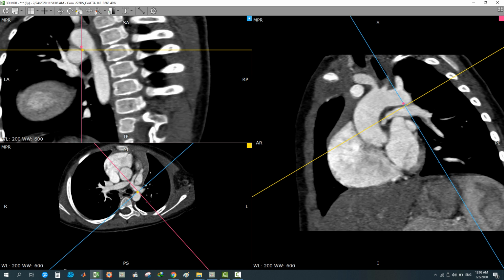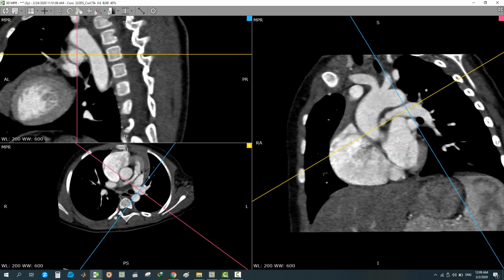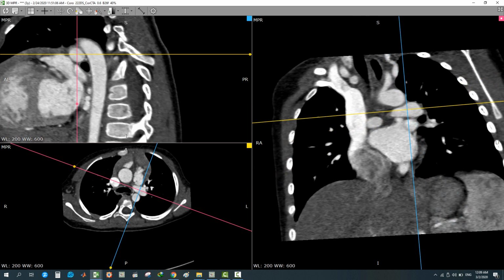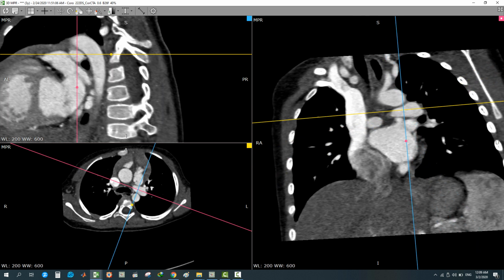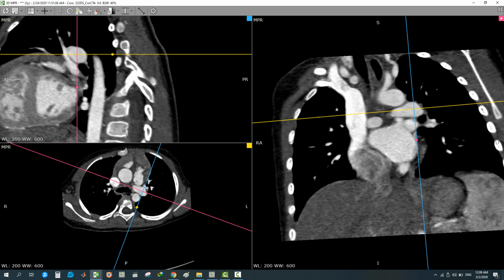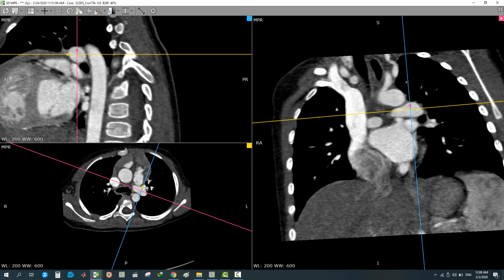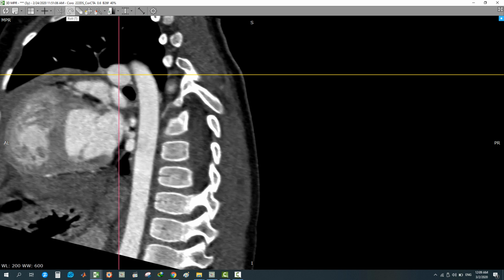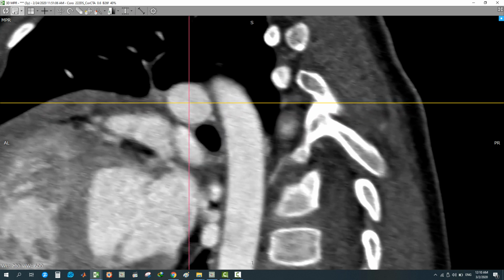Okay, go backward and readjust again like this, in this way. Okay, and move forward again, till the first branch. Then this is the first branch. After readjustment, then move backward. This represents the pre-branching diameters of the LPA. Okay, in this way, remove these lines and measure this diameter.